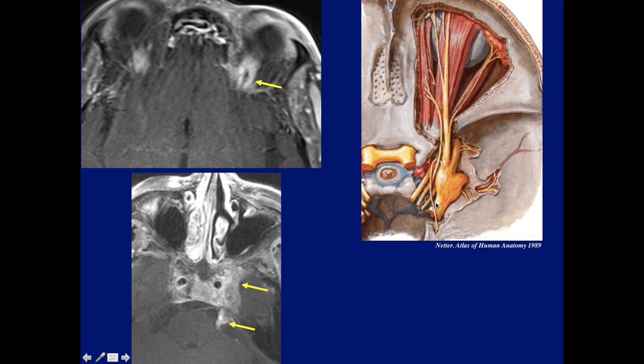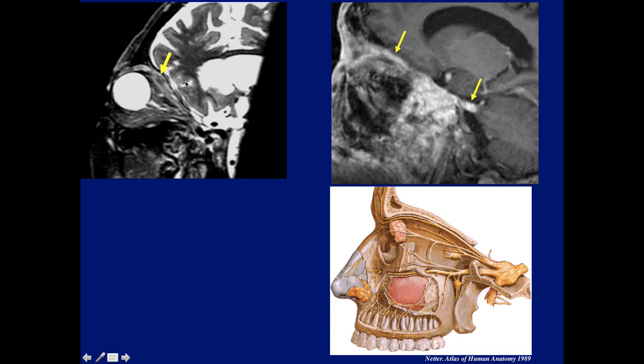Again, inoperable. And here it is on a sagittal view. We can see the thickening here on the T2. Here's the enhancement of the frontal supraorbital nerve, all the way back, and this is the trigeminal in the prepontine cistern. You can see right in front of the cerebellum, the pons here, the middle cerebellar peduncle, this whole area's perineural spread from the forehead back.